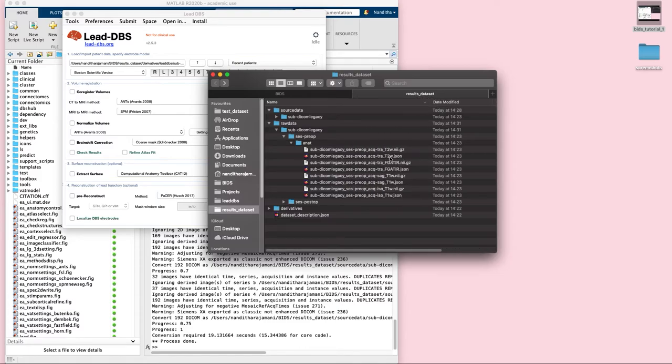So this includes the T1 weighted, T2 weighted, there can be multiple T1s, multiple T2s, FGATIR, PD, as was always supported by classic Lead-DBS, but they all exist now inside the anat folder of the raw data main folder. And the post-op, as usual, would contain either CT or MRI images.